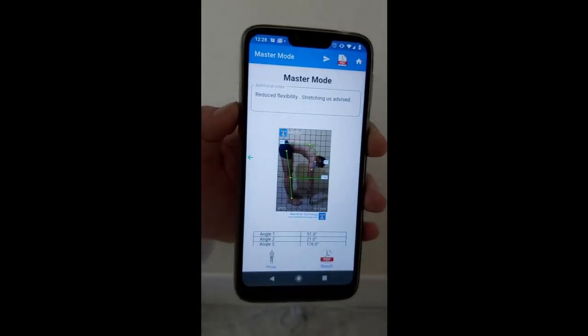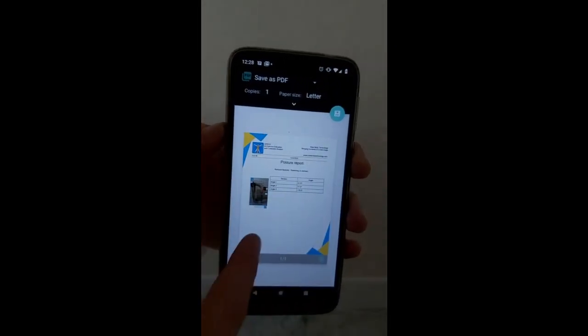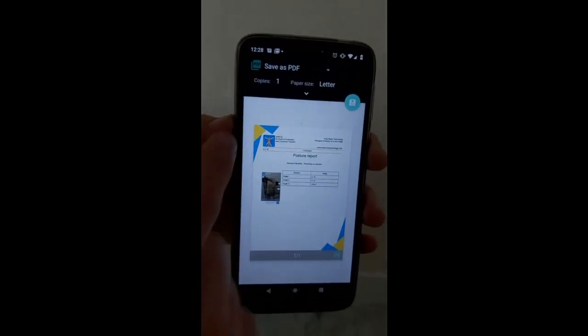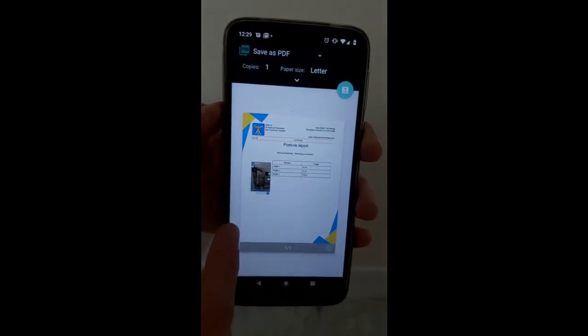Once you have finished inputting all of your commentary, you click Export PDF button, and you will receive your PDF with angles, images and your commentary here. Then you can also swap the header with your custom logo and address of your practice here.